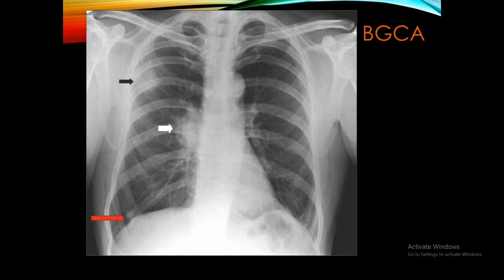Another chest X-ray تلاحظون أنه عندنا 3 أسهم، الأسود والأبيض والأحمر. الأسود يشير إلى ill-defined opacity، إذن we are dealing with the patchy opacification اللي هي mostly consolidation. السهم الأحمر يشير إلى small nodule. السهم الأبيض يشير إلى right hilum which looks bulky and spiculated. طبعا normal hilum لازم يكون concave out border، ما ممكن يكون convex. من يكون convex مثل هذا وتكون enlargement of the hilum is unilateral و spiculated. This is a key finding in case of the central bronchogenic carcinoma.